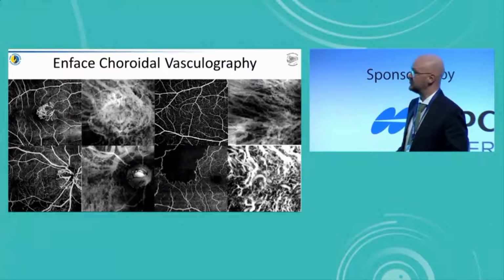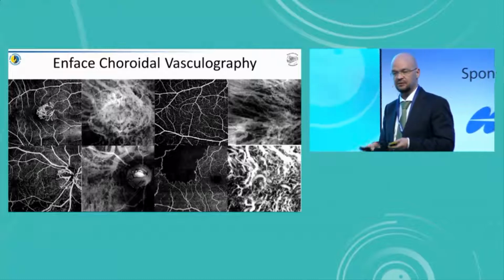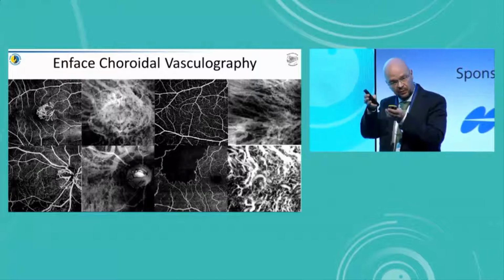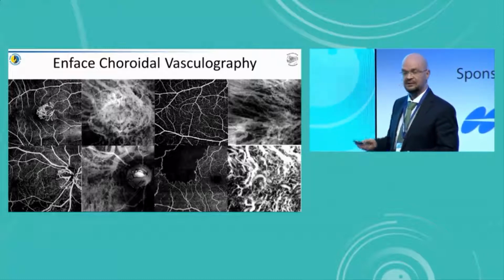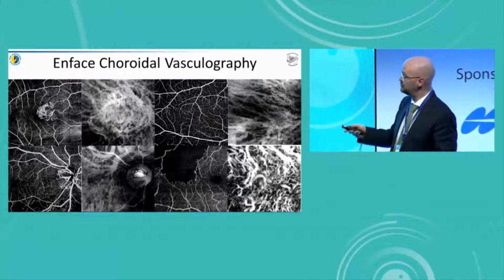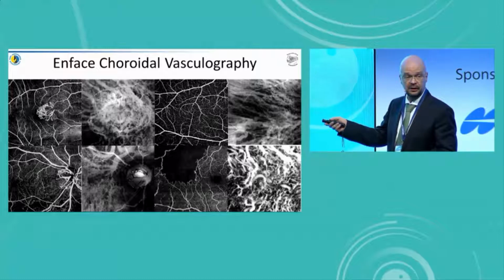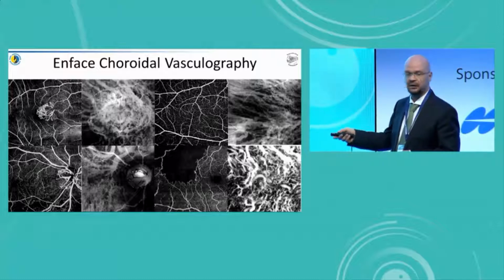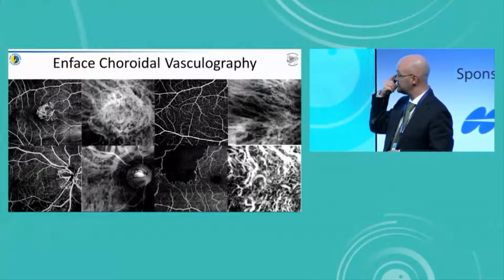But what I was looking at was the segmentation of the choroid. I went down with the choroid capillaris part, and I went down into the choroid, made the slab a little thicker, and I inverted the image. And when you do that, you suddenly get these areas that in the normal image are dark. These images are suddenly white. And they start looking very, very familiar, and they start looking very close to an image you might see in an ICG.